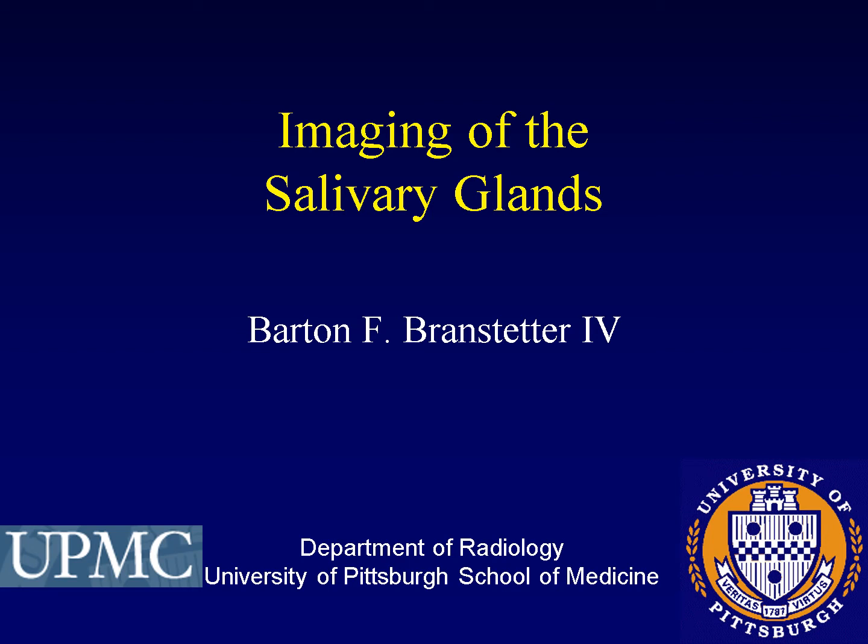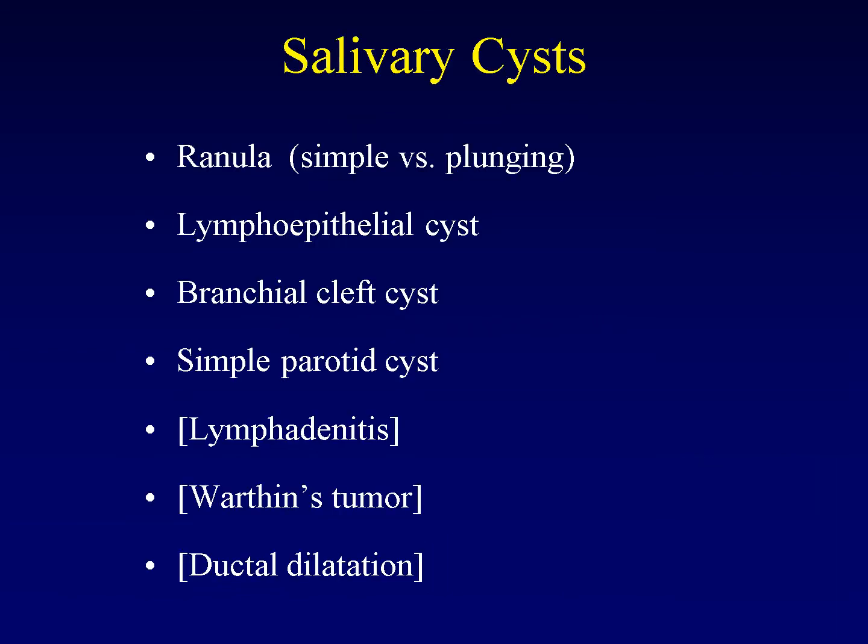This is part 4 of the lecture on imaging of the salivary glands. Sometimes we encounter cysts arising within the salivary glands. The most famous of these is the ranula, which is an obstruction of the sublingual gland in which the gland itself begins to expand and accumulate saliva.